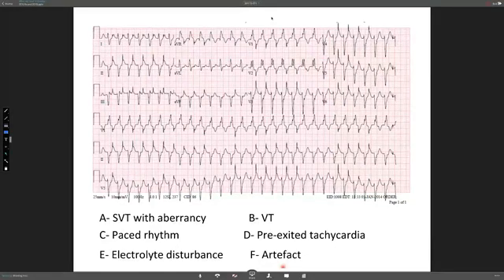The teaching in medical school and when you start practicing is, if you're in doubt or if you have a high-risk patient, it's always safe to treat it as VT, as ventricular tachycardia. But I can reassure you that this ECG was repeated several times and the patient was feeling unwell and describing palpitation. So we're all happy to exclude artifact. The patient also had observations and blood tests and all of her electrolytes were within normal range. So now we managed to exclude 2 out of our 6 potential.